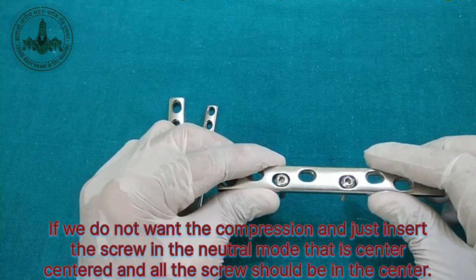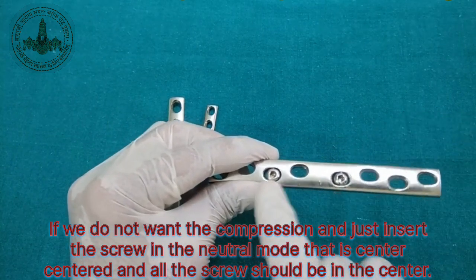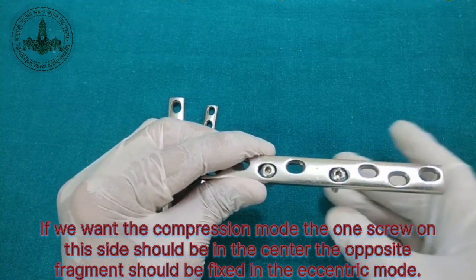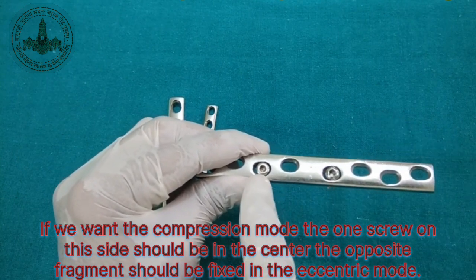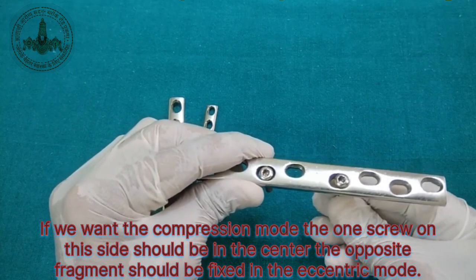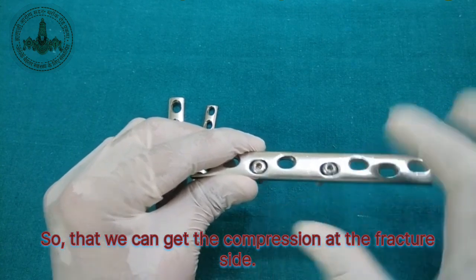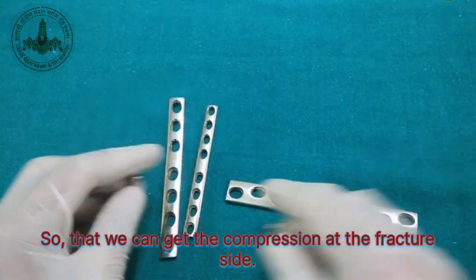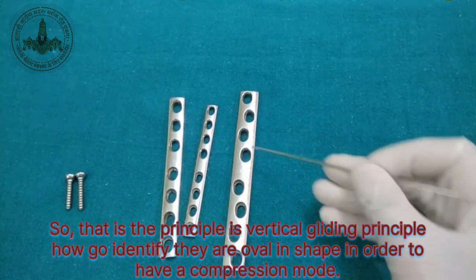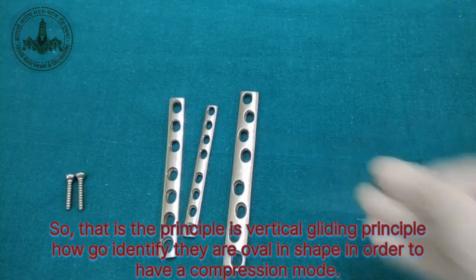If we do not want the compression, then just insert the screws in the neutral mode, that is the center, and all the screws should be in the center. If we want the compression mode, the one screw on this side should be in the center. The opposite fragment should be fixed in the eccentric mode, so that we can get a compression at the fracture site. So that is the principle, the spherical gliding principle. How to identify? They are oval in shape in order to have a compression mode.